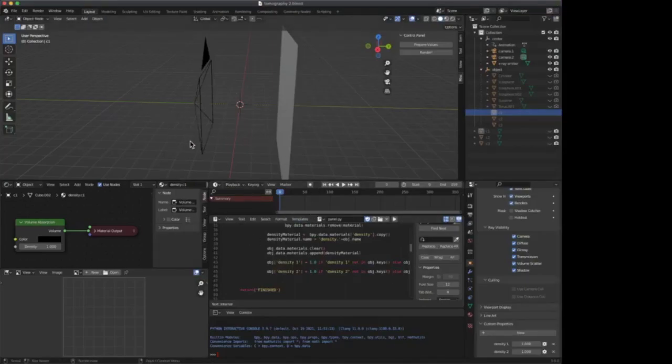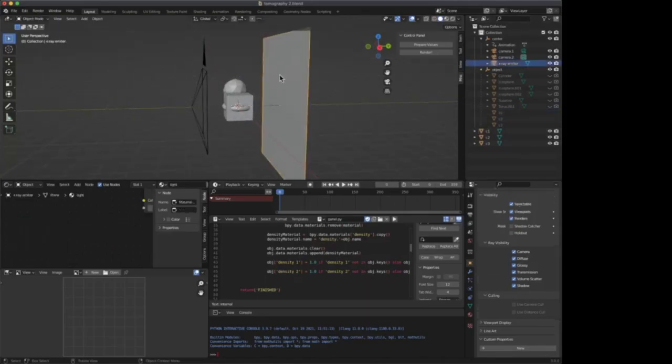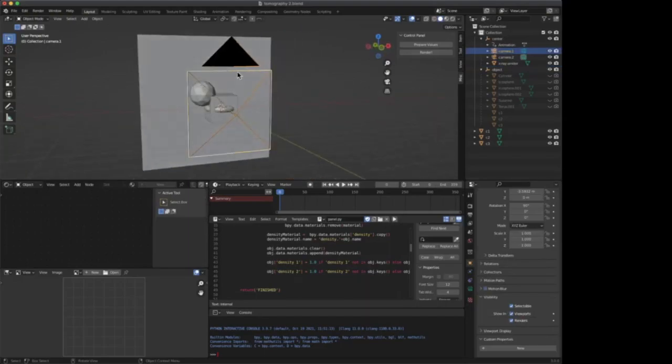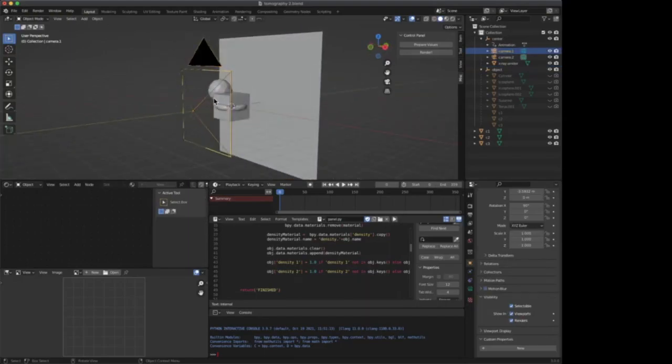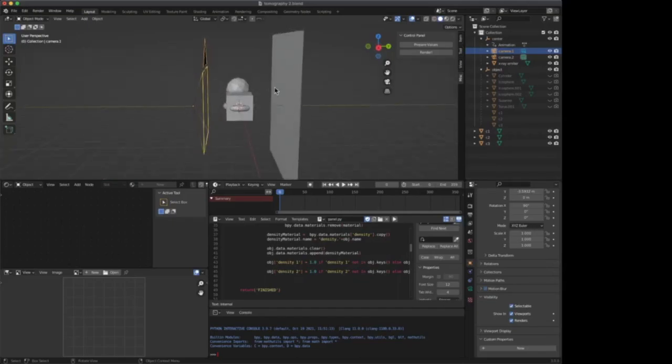The application uses Blender as an interface to draw any 3D volume you like. The template Blender file is composed of a panel light source that simulates the X-ray emitter directly in front of several orthographic cameras that simulate the detectors. The render engine inside Blender will simulate the rays going parallel, for orthographic cameras, or fan-beamed for perspective ones, from the light source to the cameras.